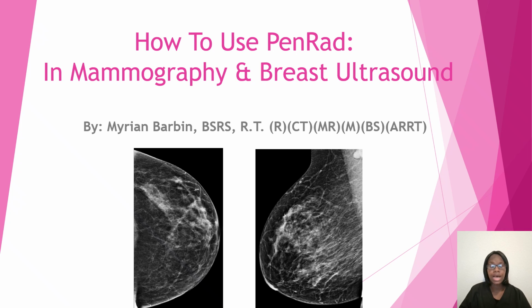In today's video, I am going to show you all how to use the PenRad charting system in mammography. This can also be used for breast ultrasound as well, because a lot of breast ultrasound techs use the charting system for PenRad whenever patients come in and they have a certain symptom. So this will be used for both techs.